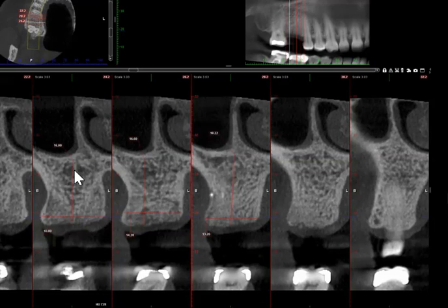Every once in a while, I do get a number that can be relatively tall, 14 or 15 millimeters in the posterior mandible, but I don't generally get this type of number in the posterior maxilla, largely because of the presence of maxillary sinus. A lot of times the sinus would pneumatize and grow inferiorly so that the ridge height is relatively short in many cases.